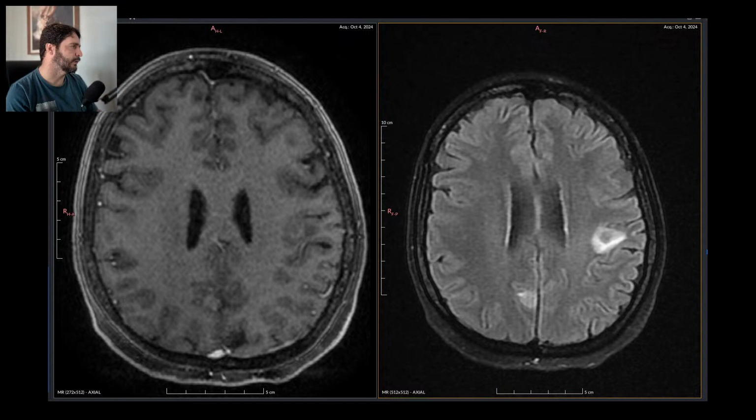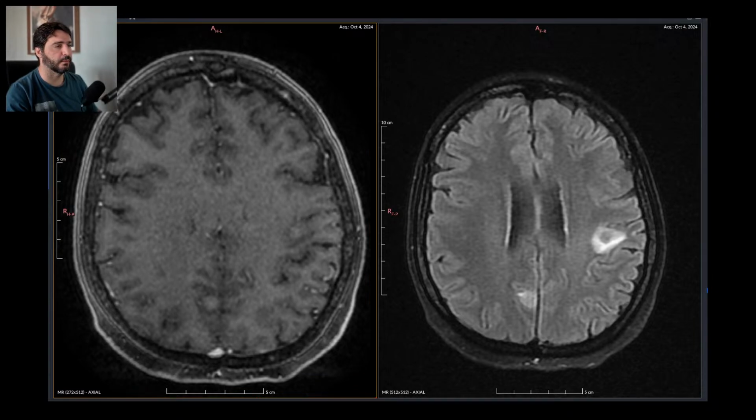No clinical history, but I would go firstly with secondary disease. At her age group, 41, it could be anything: breast cancer, squamous epithelial cancer, it could be lung cancer also, gastric and esophageal cancer could be, but I couldn't say because there isn't any clinical history whatsoever. So I'm just going to describe the lesions and be on my way because we won't go anywhere.